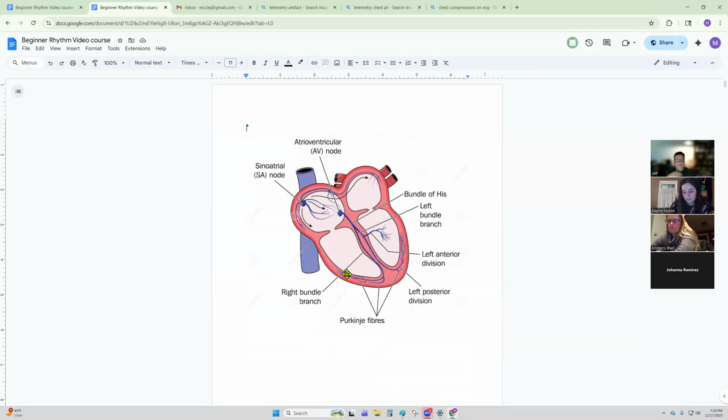And sinus pause, per the Philips definition, is between 2 seconds and 4 seconds. After 4 seconds, the machine is going to call it asystole. Technically, asystole is the ending of all activity, be it atrial and ventricular. It's kind of weird because it should go sinus pause, which is just a small gap of time, then sinus arrest, which is just a longer amount of time, but sinus arrest will come back, or something else will pick up the slack. That's where you'll get escape beats.